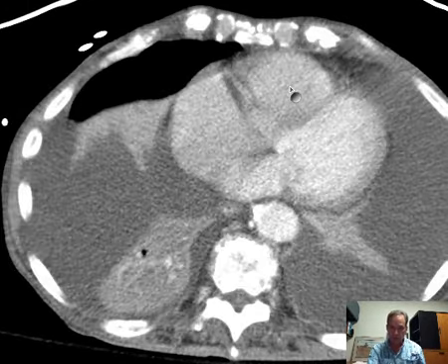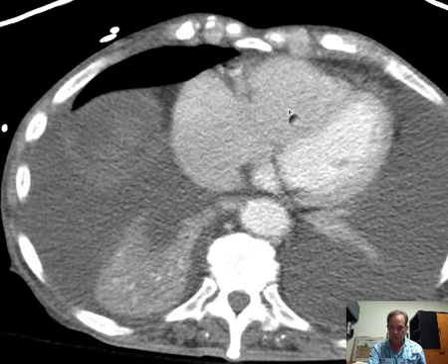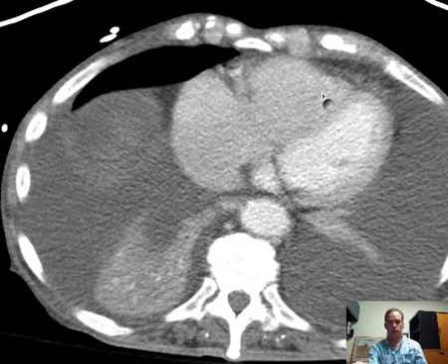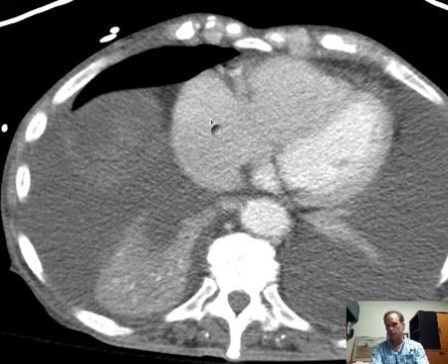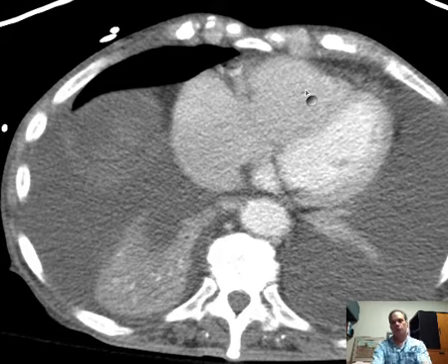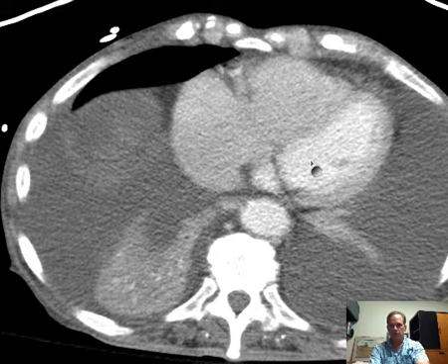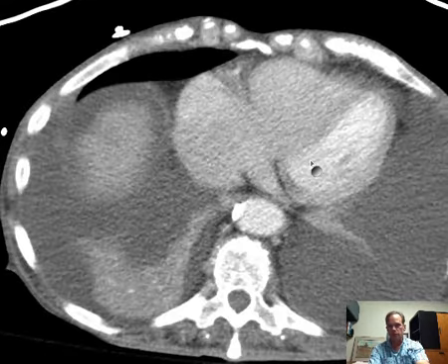Follow this down. What do we have? The right ventricle. How do I know that's the right ventricle? Well, first of all, this is right ventricle and this is left ventricle. The right ventricle is a little bit more rightward than the left ventricle. But even more so, it is anterior compared with the left ventricle. The right ventricle is anterior. They could have called it anterior and posterior ventricles, but I don't think that would have been as appealing or usable in daily terminology.